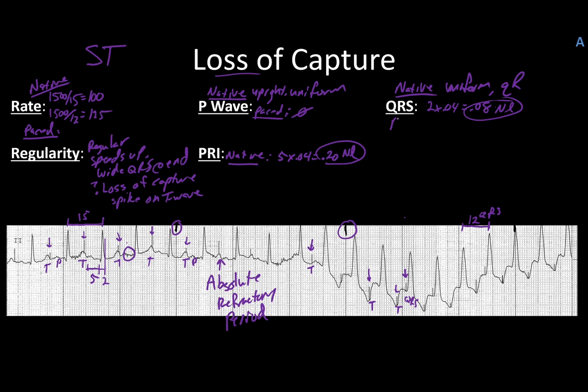From the pacing standpoint, we've determined that the pacing at the beginning has nothing to do with much anything else that's going on. And so at that point, there's not much to be said or done about that. Towards the end here, though, it's a bit of a different matter, especially on beats like this one right here, where it looks like that pacer spike may be responsible for the QRS, but I don't see that on the other ones.